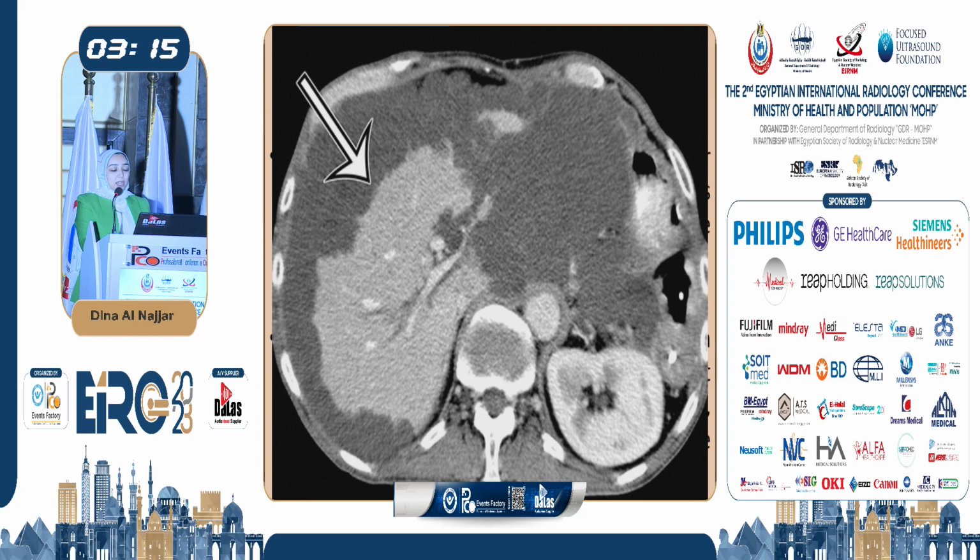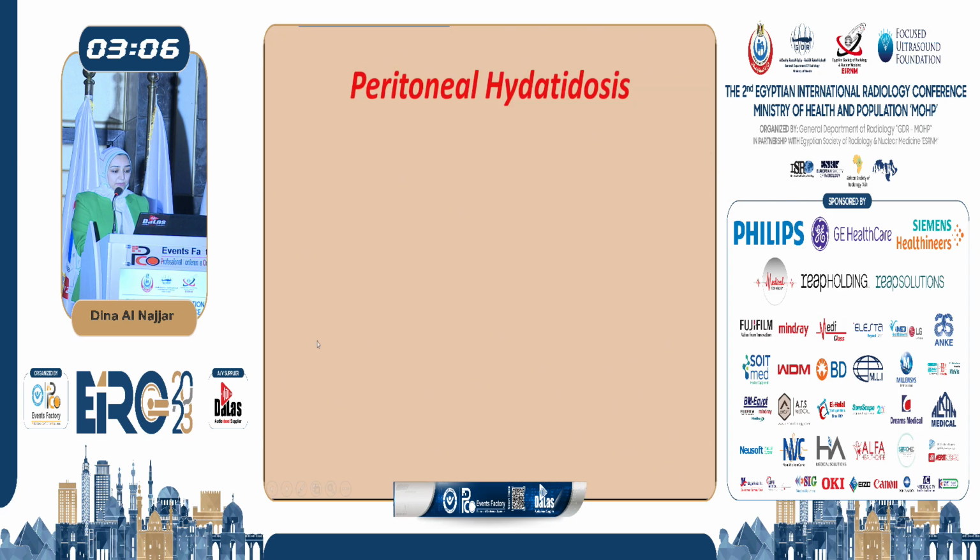As shown, this is very thick ascites, but scalloping of the contour of the liver raises the possibility of pseudomyxoma peritonei rather than simple ascites.